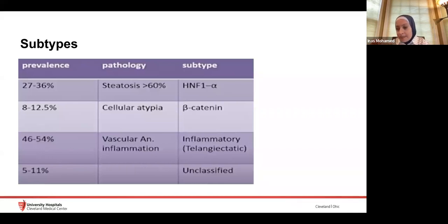On this phase, everything is going to lose the contrast except bile, which means the bile ducts are going to be contrast opacified. The bowel, like the duodenum, is going to have anything that has bile in it.